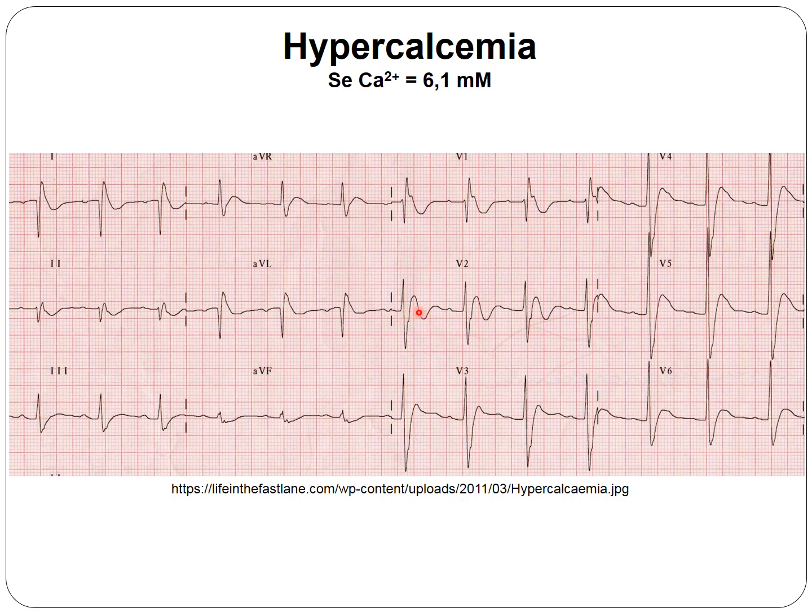Looking at the QT interval, it is very, very short. So this can be the sign of hypercalcemia. But looking, for example, for the pathologic Q wave, we do see one in lead 1 and aVL with ST elevation, so that could indicate an acute high lateral myocardial infarction.